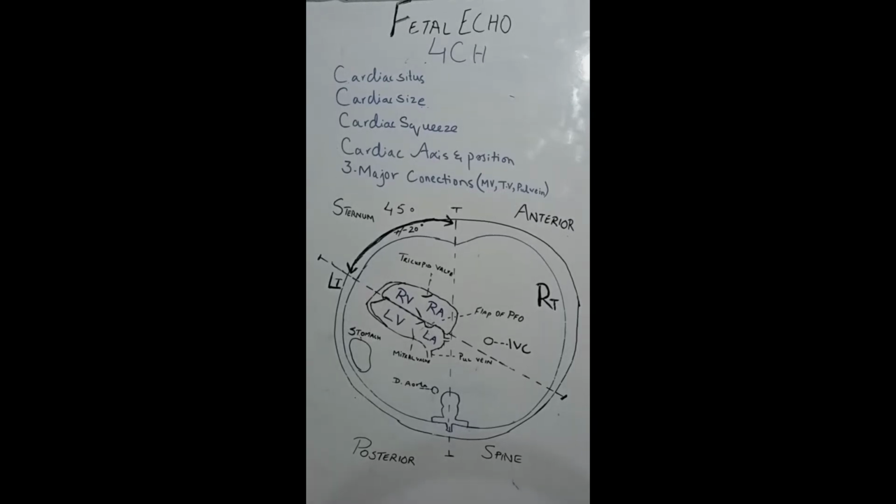Now, what we can see on the four-chamber view, number three, is cardiac kinetics. If the heart does not pump blood normally during systole and diastole, it means that the mitral and tricuspid AV valves are not working well. So it refers to dyskinesia.